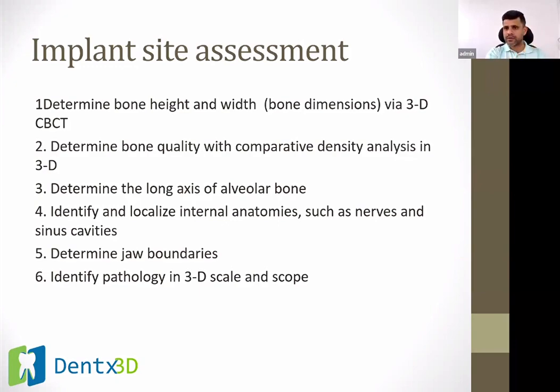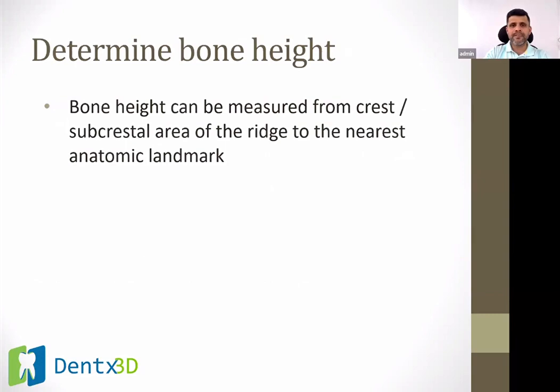The way it will be in the surgery, in a better way, where you can measure the bone which is there and see where your nerve canal is, see where your sinus is, and you plan your implant so that it is properly placed. Right? So that is what you can do with the CBCT scan when you open it on your computer and see the patient on your computer before you do it in the surgery.